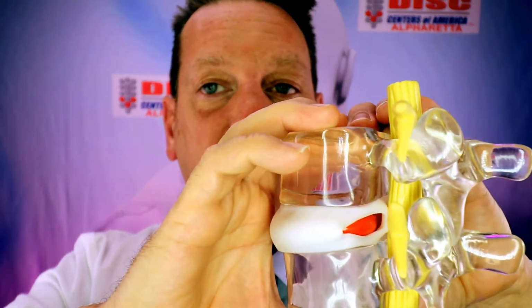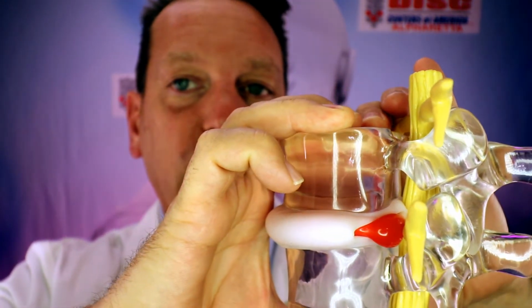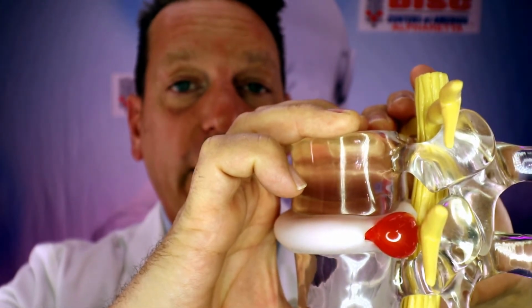If you see the terms protrusion or herniation, technically they are the same thing, except a protrusion describes it a little bit more in detail than a herniation. That basically means that the inner jelly that was on the inside, the nucleus, has now gone outside of the disc. So if you watch this, you'll be able to see how that disc material can start to push out. And the problem is when it does that, it unfortunately usually can only go into one of two areas.